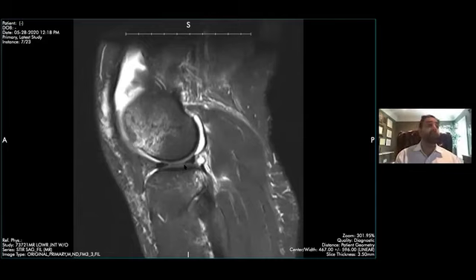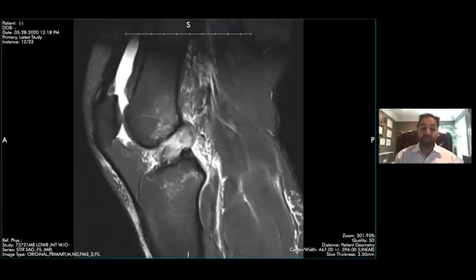This happens in people like skiers or American football players. When a valgus load is applied to a knee with the femur in internal rotation or the tibia in external rotation, right? So if a valgus load is applied to a flexed knee where the femur is internally rotated or the tibia is externally rotated, you get this pivot shift injury mechanism where you get loading on the ACL, and the ACL is pretty much torn. And you get these microtrabecular contusions in these areas.